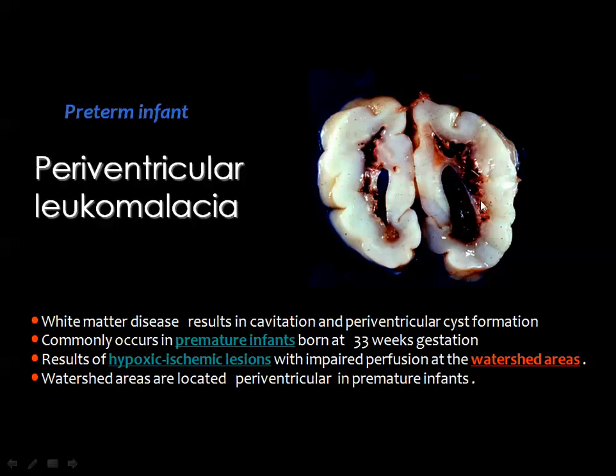The ischemic white matter will appear hypodense in the CT scan and of low signal in MRI T1 and high signal in T2 weighted images. This hypoxic white matter will progress rapidly to form cystic areas of encephalomalacia, and this will affect the appearance of the ventricle, which at this time will have a characteristic appearance, as you can see.